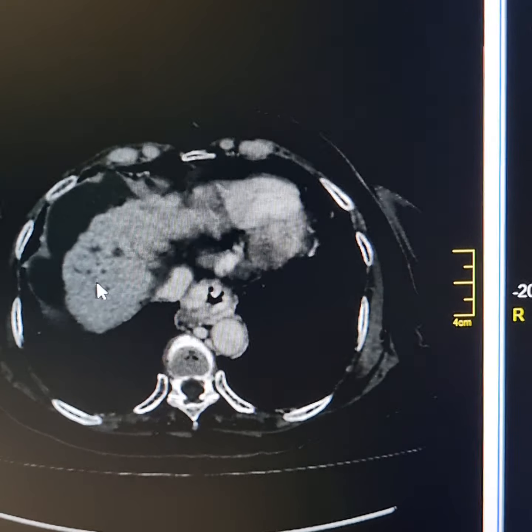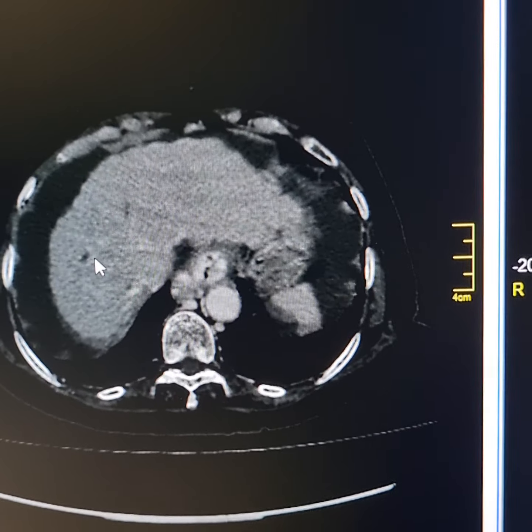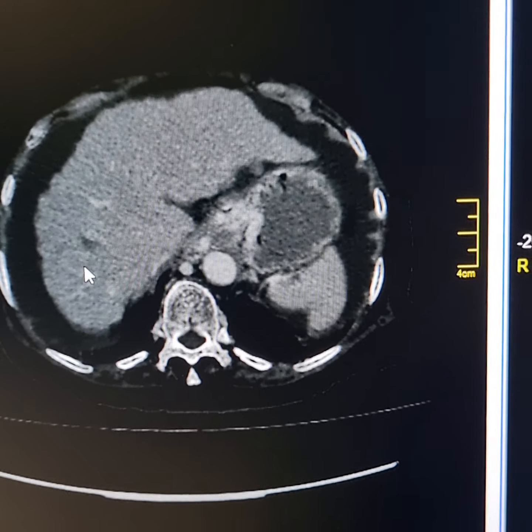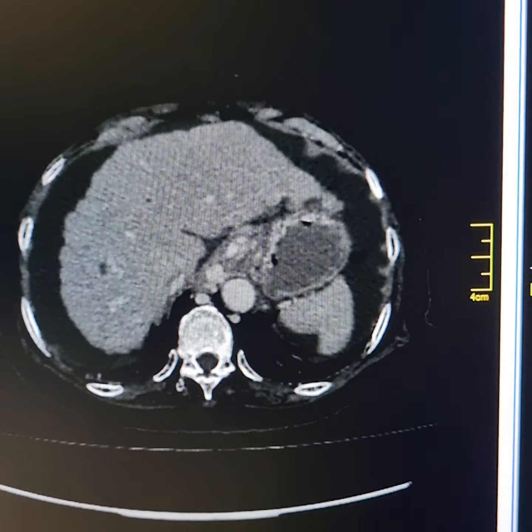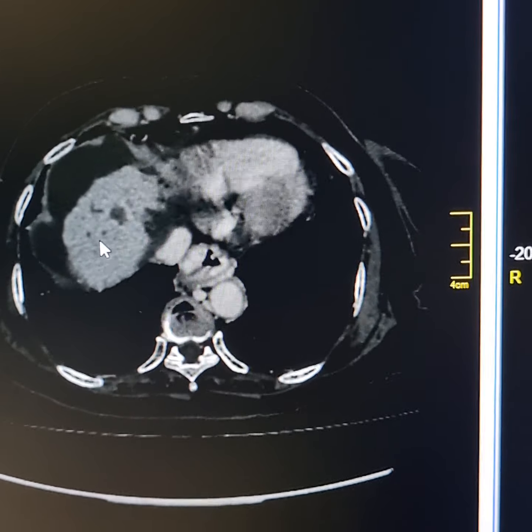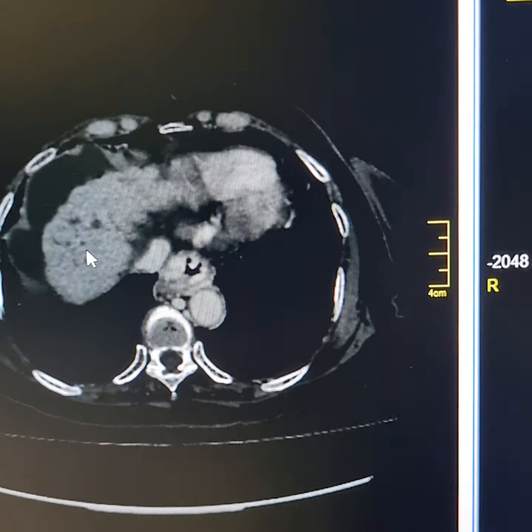But this all is the area of altered texture, although only this part of the lesion is visible more clearly, being hypodense. But this also appears to be hepatocellular carcinoma. Now please observe the non-enhancing tubular channels in the vicinity of this hypodense lesion. These represent peripheral thrombosed branches of the portal vein and not dilated biliary channels.